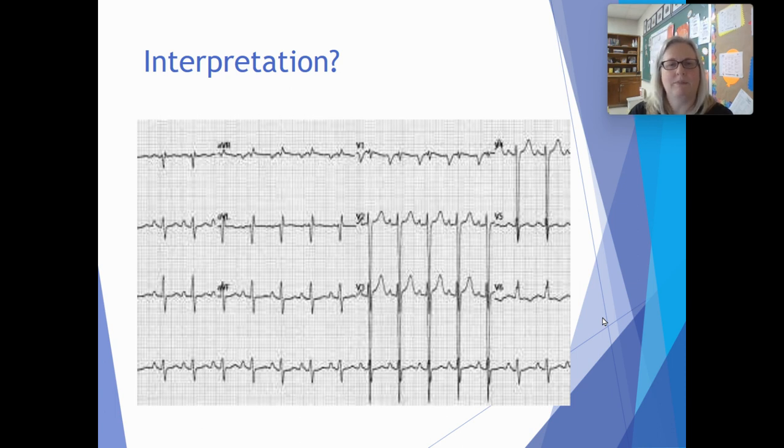V1. That T wave doesn't look normal. That T wave is inverted in V1. But do we have any other T waves that are inverted anteriorly? No. So that means it's, what's the word? Non-diagnostic. If you only have one lead in that area that has a change, it's non-diagnostic. So that inverted T is non-diagnostic.